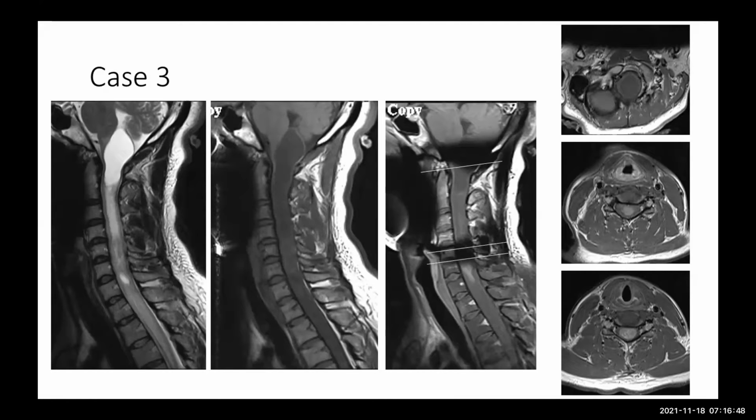I would think that this is more extradural. You think this is extradural? So here's the dura here, right? So extradural would be out here. So this is definitely intradural. The question is, is this inside the spinal cord or outside the spinal cord? Based on this imaging, he's got some contrast enhancement down here in the spinal cord. So this would be under the category of intradural, intramedullary. Got it. All right.